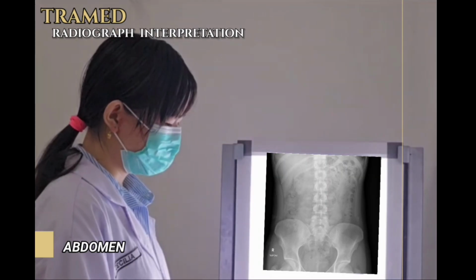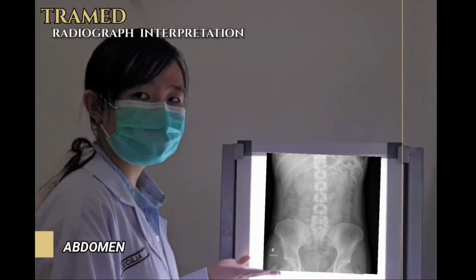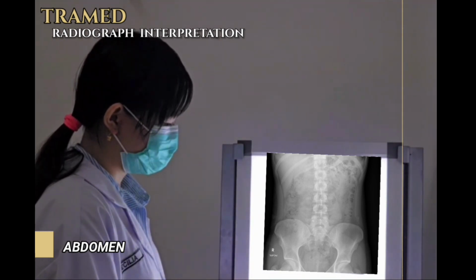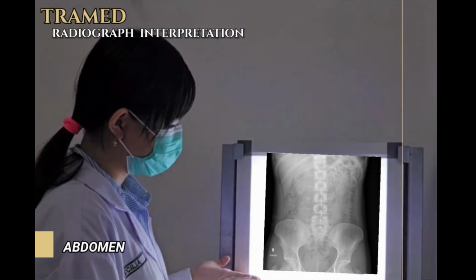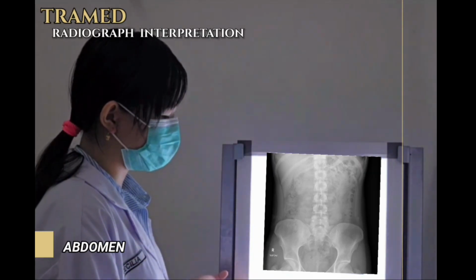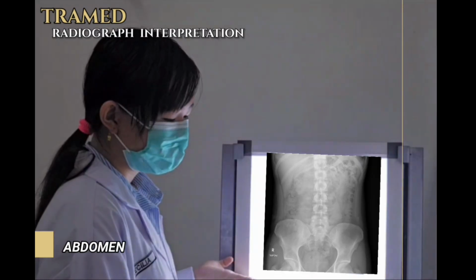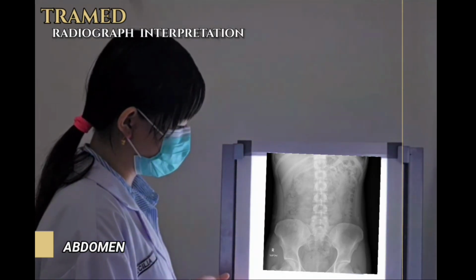And for the abdomen, we evaluate image adequacy for the supine abdominal AP. The first is adequate penetration. It's adequate and symmetrical of the ribs, the iliac crest and also the obturator foramina. And there is no motion artifact. And after that, there is no abnormality.